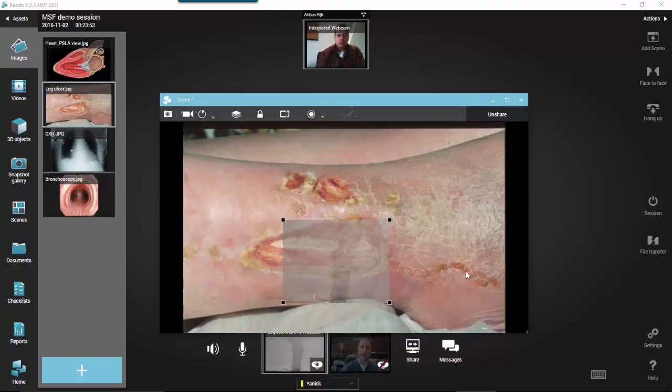And I would take my scalpel handle and here, and I would be able to say, oh, you have to cut this area here, remove that part. So it allows you to do this live superimposition and work on the feed of the other user, so that you can tell them exactly what to do, and they can literally follow you step by step to do a procedure or to help, with a piece of equipment.